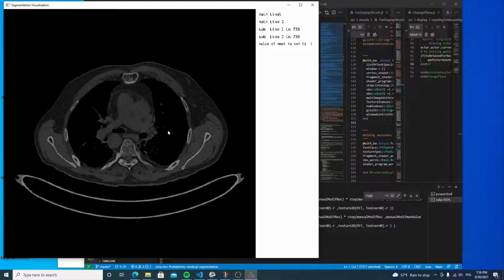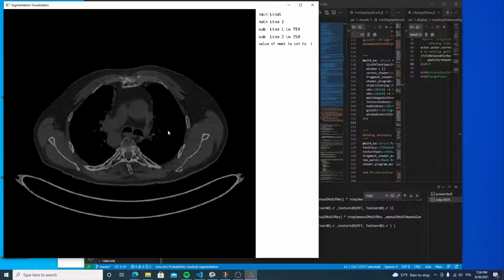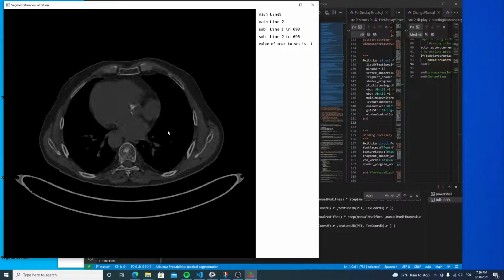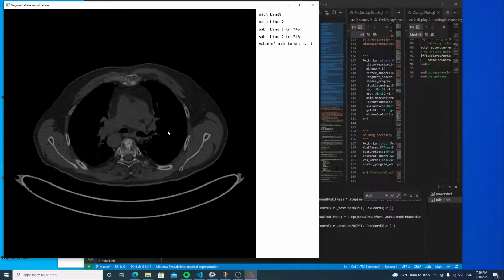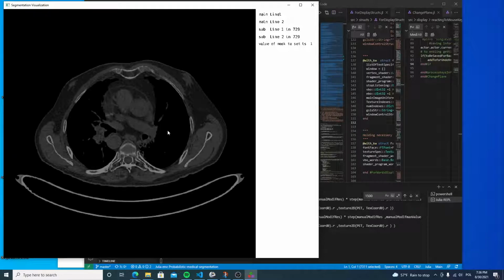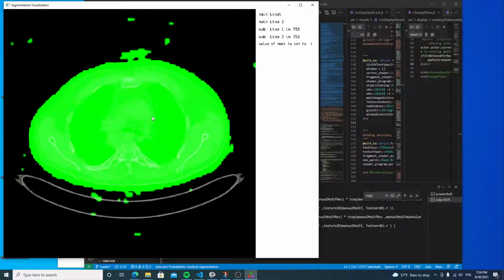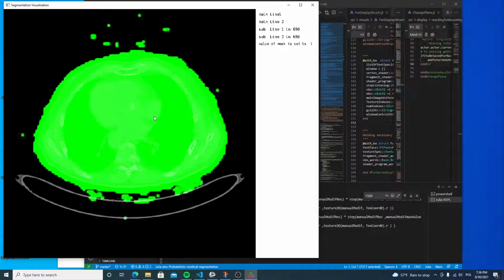And we can see that everywhere generally the PET values were present. So we do not see anything interesting here. But if I press Shift 1 M2, you would see that everywhere is PET. This is just a pathological example, let's say.